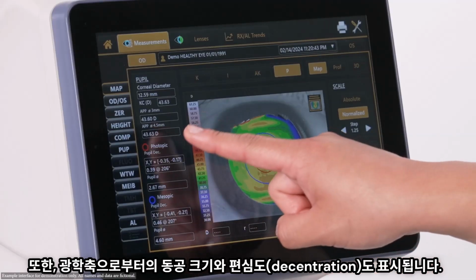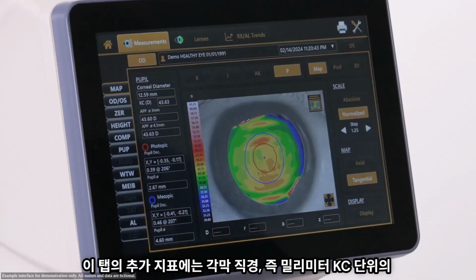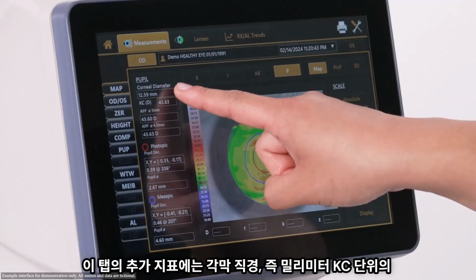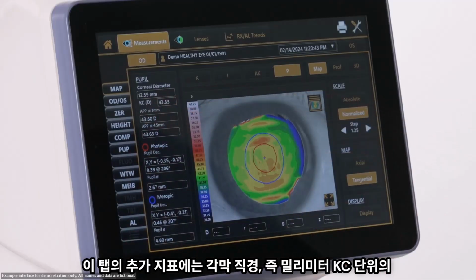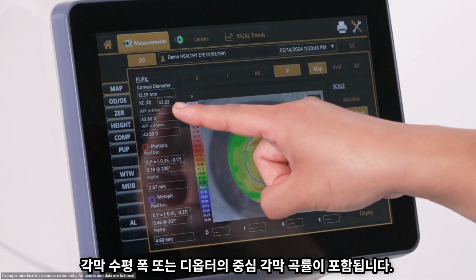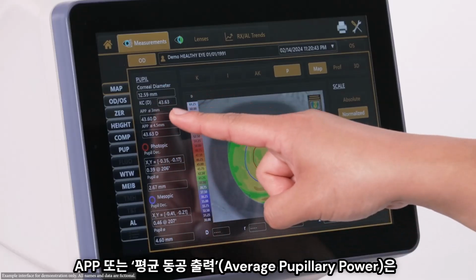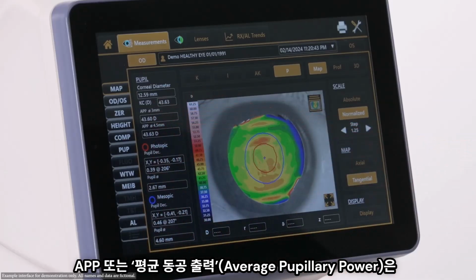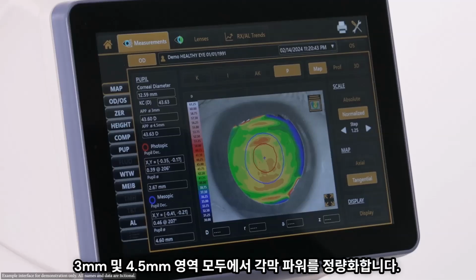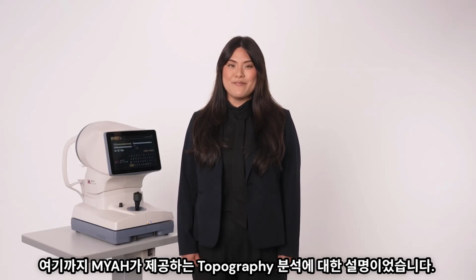Pupil size and decentration from the optical axis are also displayed. Additional metrics in this tab include the corneal diameter, in other words, the horizontal width of the cornea in millimeters, KC, or the central corneal curvature in diopters, the APP, or average pupillary power, which quantifies the corneal power over both 3 millimeter and 4.5 millimeter zones. And that's an overview of the topography analysis that's provided by the MYAH.